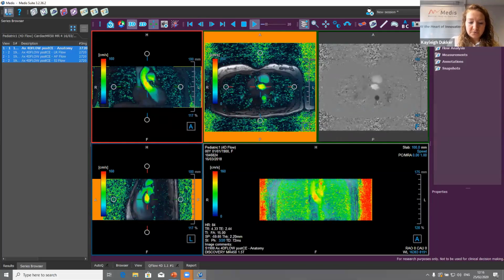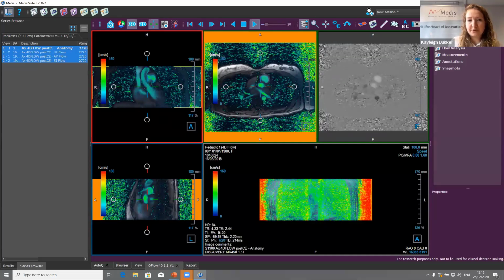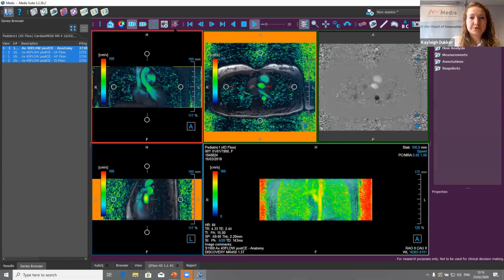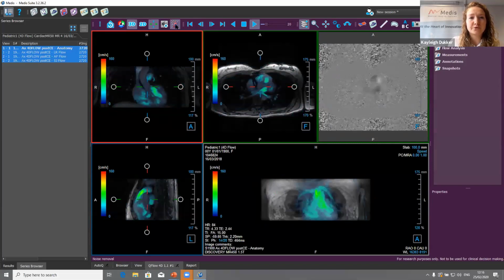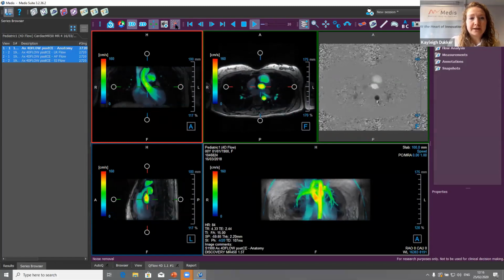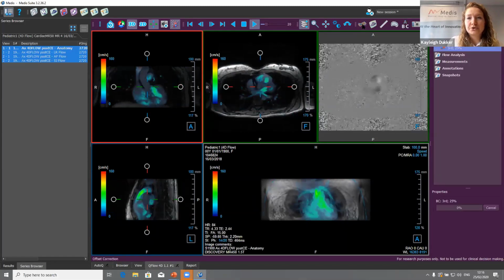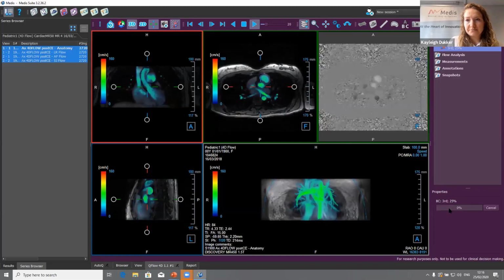So for location-specific flow measurements, currently this 4D flow application is generated. So the first step in there is to do a noise removal, so we can get really more focus on the flow. So it's here visualized with the speed. And I would also want to do for these measurements a background correction. So we can see the progress in here.